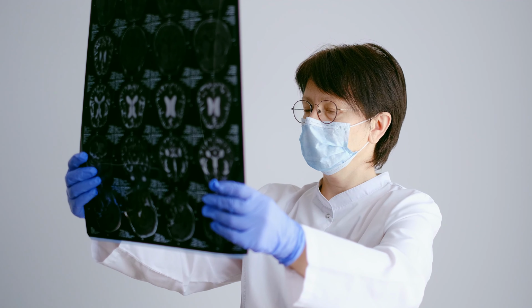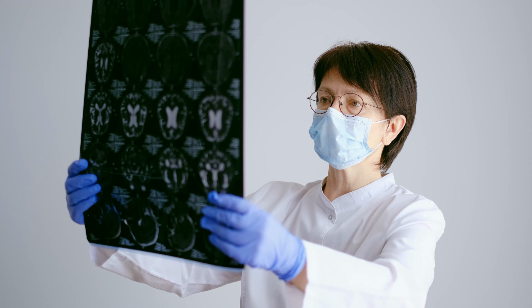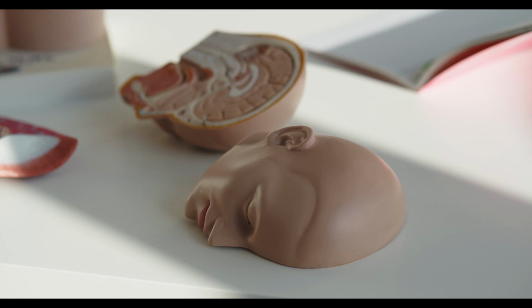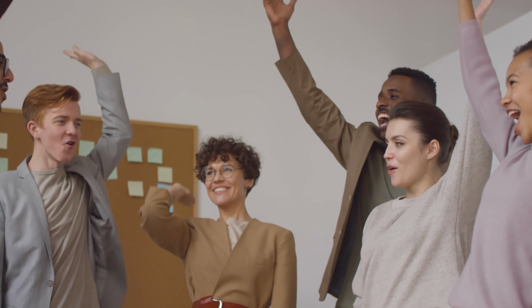Whether you are a medical student, an intern, or a resident, this video series is specifically designed to give you a solid foundation in interpreting the CT scans. Let's get started. To learn CT scan, we need to have sound knowledge of brain anatomy. But that's boring, right? So we'll try to learn it in a reverse pattern.